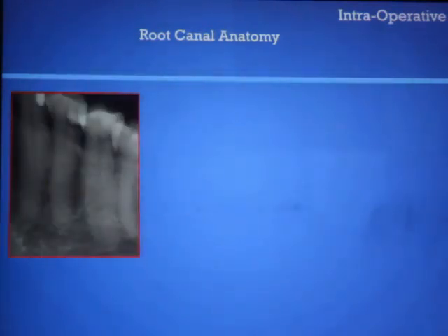So when I saw this case on a mandibular premolar, we can see a single canal in the center of the root in the coronal aspect, and then suddenly it disappears. It looks like calcified underneath, which is a typical sign known as a fast break phenomenon, where a large canal suddenly disappears on the radiograph, indicating it is dividing into 2.